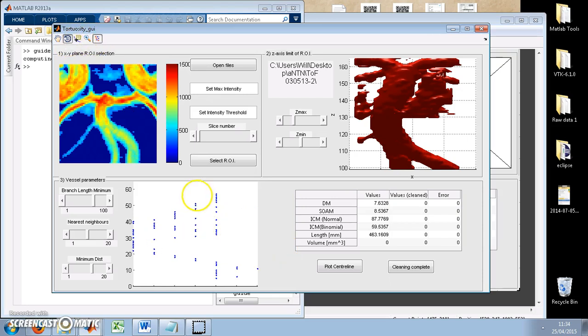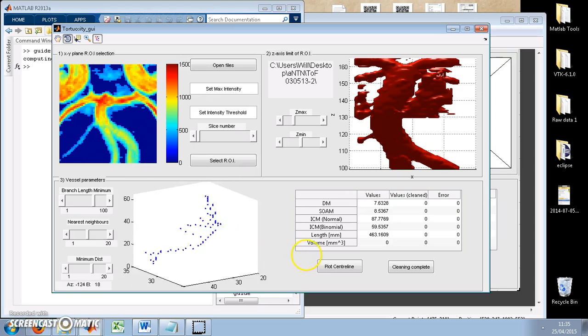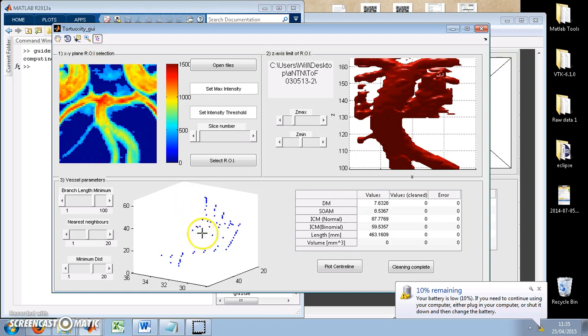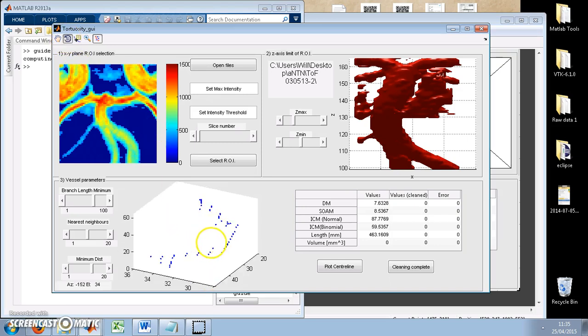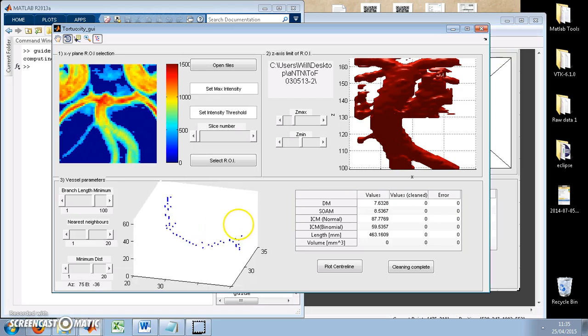I would say that from the few scans that I've done, the basilar is the hardest because it's the smallest. So you want to rotate it from each different angle, just to ensure that there aren't any dodgy branch points.